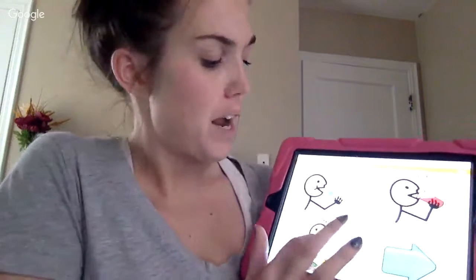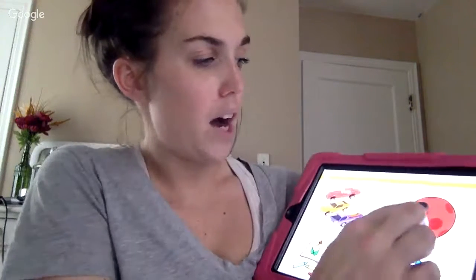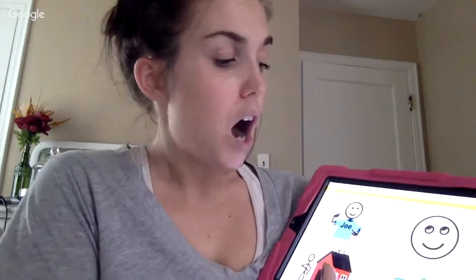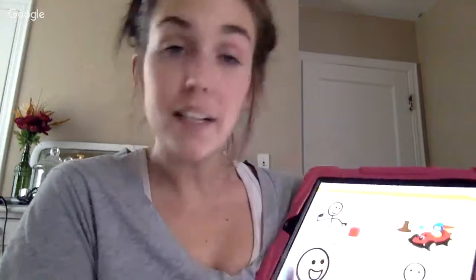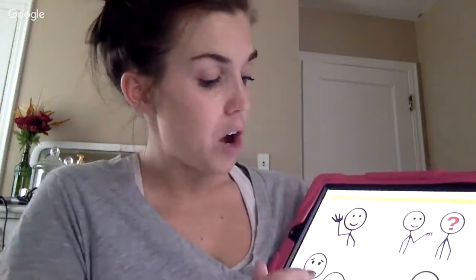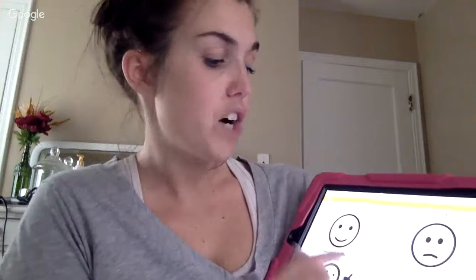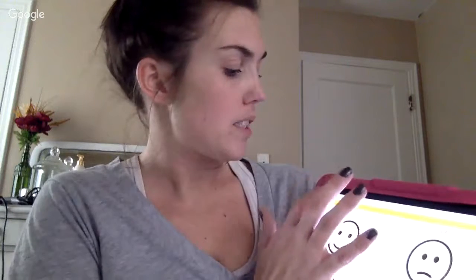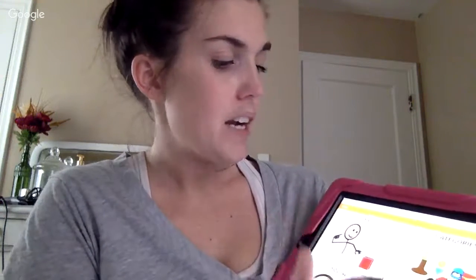Within this basic level, you can also do things such as I want to play, and then you have more: ball, throw it, roll it, bounce it. There's a lot of different options. All about me: I like, my name is, so you can get some of the social stuff. As far as social, how are you, hello, I feel, and then it can go even further: I feel sad, I feel happy, good, sick. It gives you even more options. This is the most basic, but there are so many different avenues which really let the user explore and travel through, and it can get very specific.